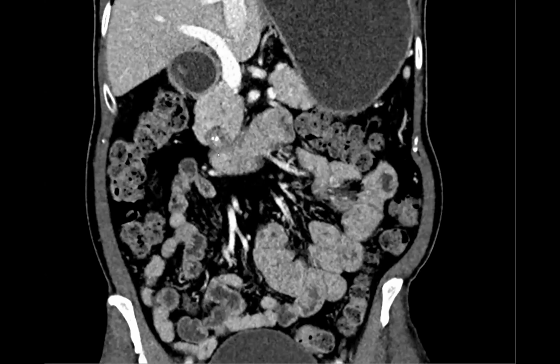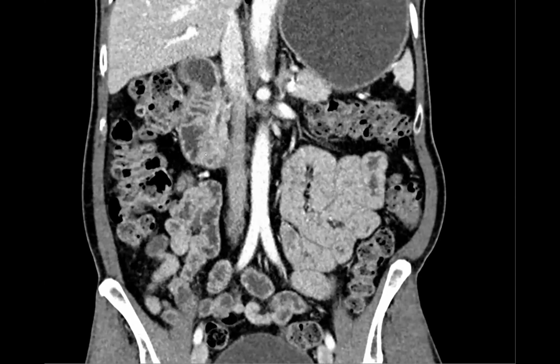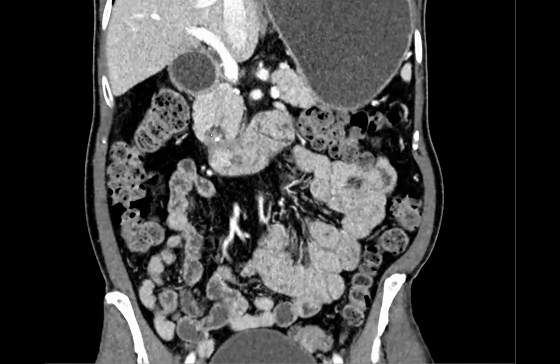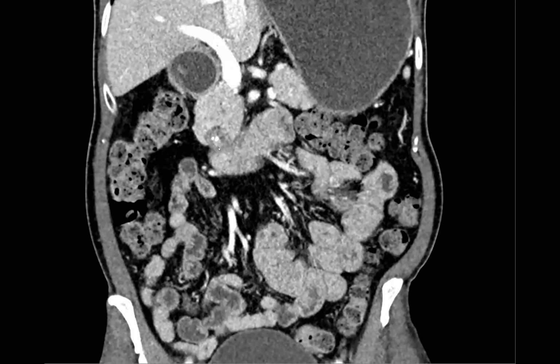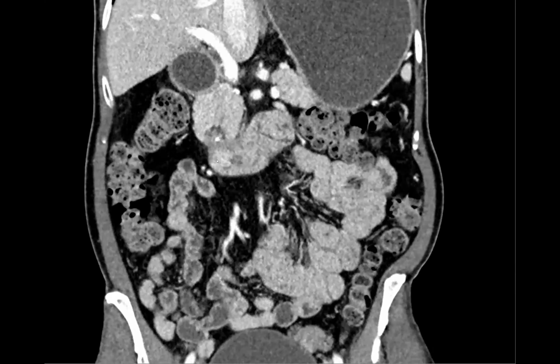Okay, great. All these are good questions. So Nelly, I thought exactly the same thing as you. I thought this is a duodenal cancer that's invading the pancreas, and then maybe it's causing dilated side branches that are mimicking the serous cystadenoma. It's serosal too, it's not like a submucosal mass. Interesting. Okay, I'm curious to see what this thing is now.